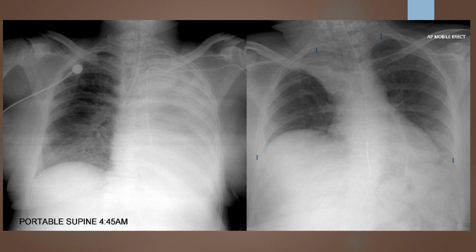Now we're going to go ahead and start looking at the more fine details. So here I'm going to start with my midcoronal rotation. I am very obviously rotated on this patient. Here's an SC joint, here's an SC joint, and the spine is way this direction. Again, I have an increased distance on my right SC joint from my vertebra, indicating that my patient was in an RPO projection.